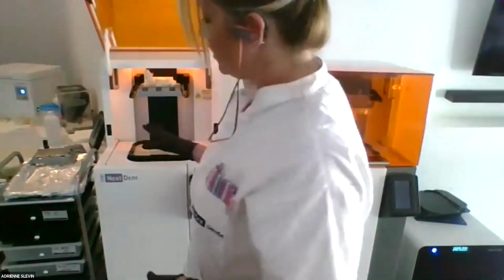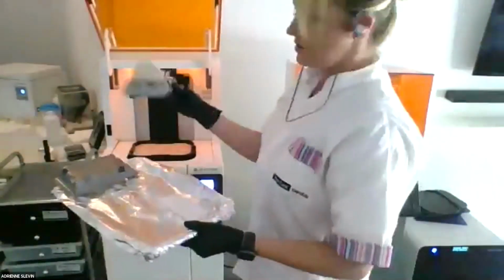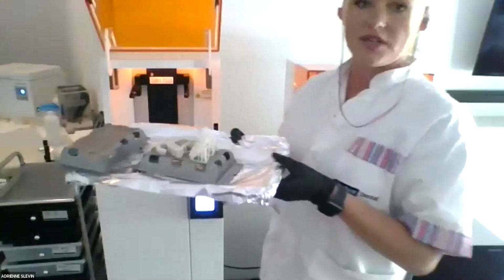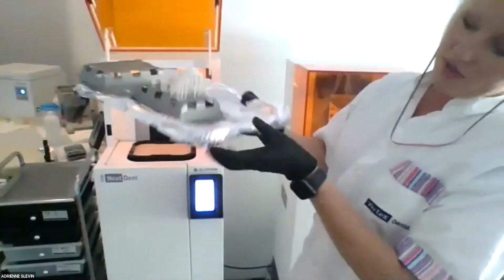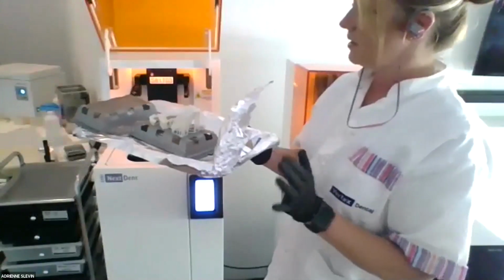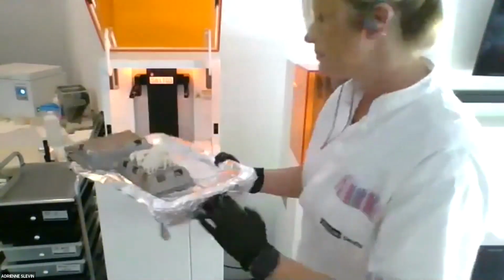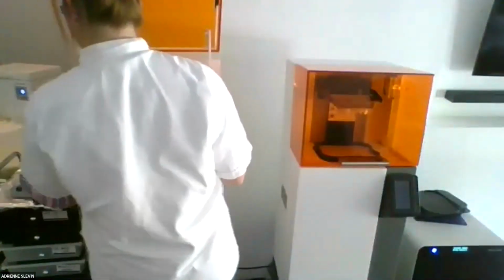And what I have here is my mixer and everything, but I'm going to use this cookie sheet. I found that it's really easy to put some foil on, and you'll be able to clean everything easier when your printer isn't right next to your cleaning area. So I also have a mixer or a stir.